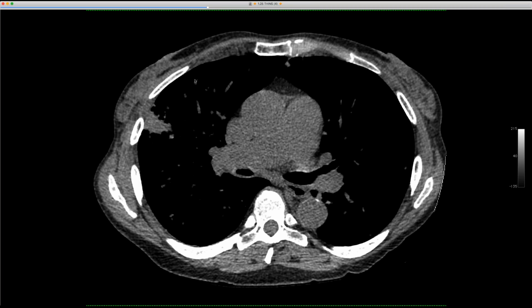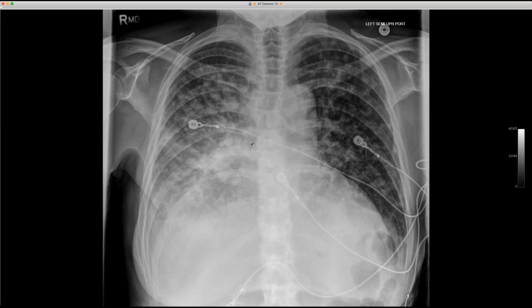And this is the most recent image. You can see it's still pretty advanced, and this grew out the blastomycosis, so the budding yeast. Turns out the patient lives on a lake, and of course everything's pretty much just about thawed here, although we had a nice spring snowstorm last week across the state. But we see a couple peaks this time of year from this disturbed soil, but there's also a latency of up to 3 months. So we do see it in the earlier winter from fall exposures.